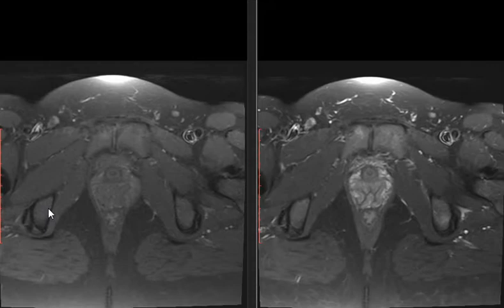Lymphangioma. It's one of the possible differential diagnoses. Good. What else? Hydatid. Well, hydatid usually causes mass effect. This does not cause mass effect. Second, it's not single, it's multiple, each of them a large hydatid structure. Third, hydatid is not infiltrative. It's a space. It does not extend between things. Well, okay, we can put multiple hydatid.